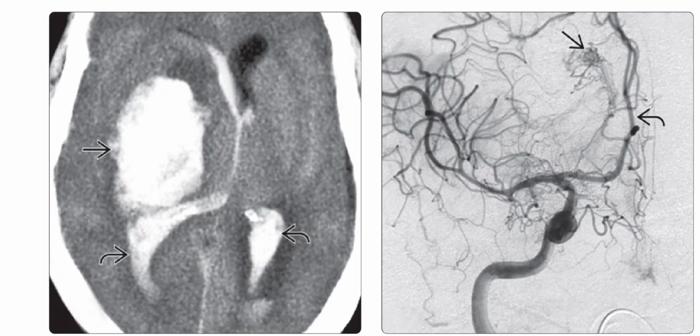Left image is the axial non-enhanced CT scan, and it shows what appears to be a classic hypertensive striatocapsular hemorrhage with intraventricular extension. However, in this young patient, underlying etiologies must be considered, including drug abuse and vascular lesions.